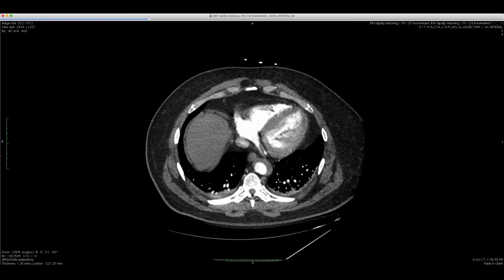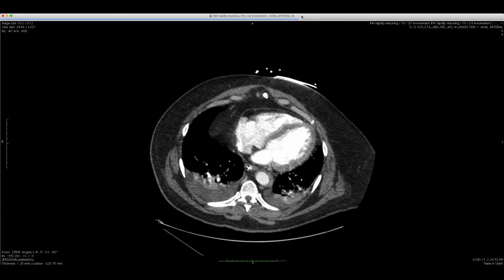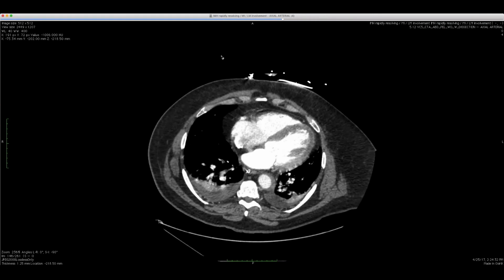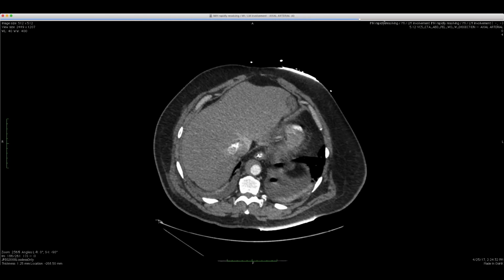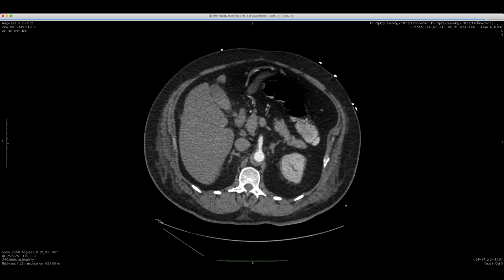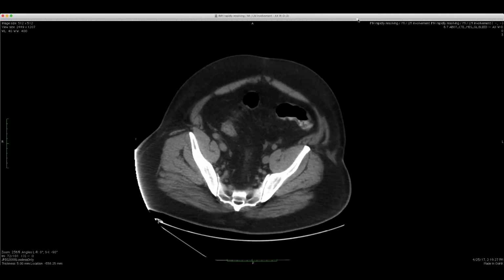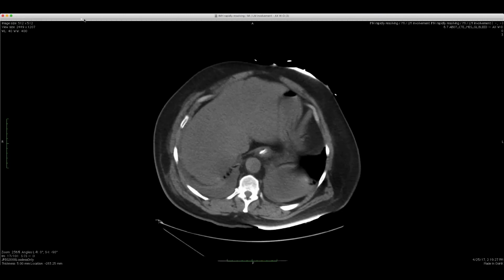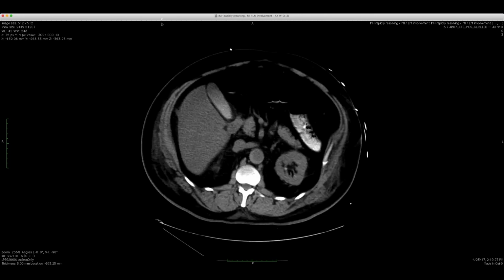There was another follow-up CT here that we did internally, and now you can see the perfusion abnormality of the LV coming in right here along the anterior wall and the septum. Coming down, you can see that. Let me show you the without. So you have to take my word for it, but on the first study, the process here was not high attenuation, but it became high attenuation on this follow-up scan.